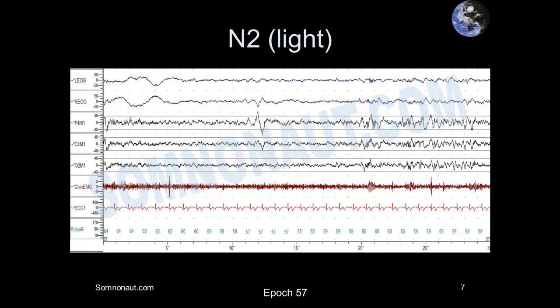So what we see in a classic page of sleep recording, here we have a montage that has eyes on top, followed by 3 right hemisphere channels, and then the EKG and heart rate. In the EEG channels, we see 2 lines per channel. These are each set at 37.5 microvolts, so the span between them is 75 microvolts, making a handy ruler for the channel. And typically the EEG pattern rotates around the 0 point, so we can expect to find the waveforms to be 75 microvolts about the 0.